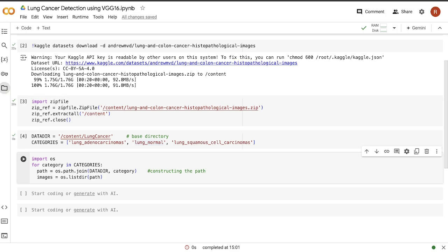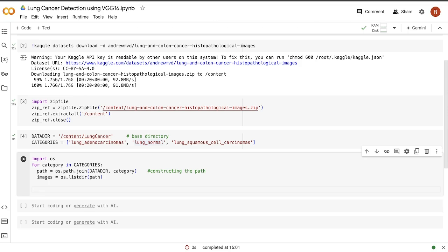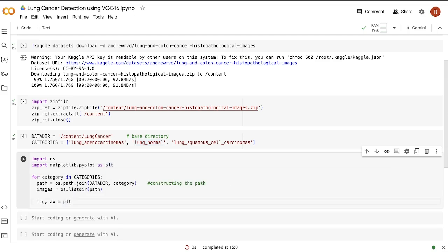To do that, we will make use of subplots. So let's say here, first we have to initialize the subplots. So we'll say figure, axis is equal to plt. Now here we have to also import matplotlib. Import matplotlib.pyplot as plt. And here we will say plt.subplots. Then in every row, you want 3 random images. That is, we will have 3 columns. Hence 1, 3. And then we also have to give the figure size. So let it be 10, 4. You will see how it works.